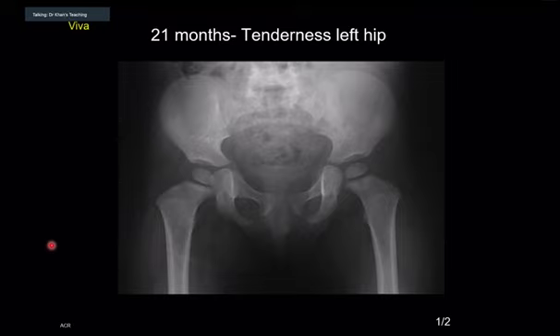Right. And what about the capsular or the gluteal fat plane? If you compare it with the right side, though it is a subtle finding, do you feel that that is also slightly distended? Yeah, I think I see it now slightly more compared to the right side. There's some subtle changes in the capsular fat pad as well. Right. Okay, thank you. I'll show you more cases, so you remain with us.